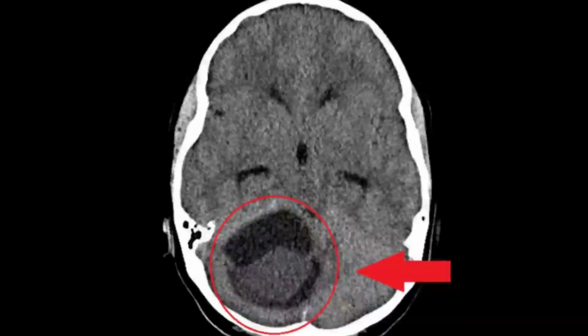Well, as you know, diffuse astrocytoma is graded as grade 2 by the WHO classification. In this case, this is not grade 2 or diffuse astrocytoma. This is actually a cerebellar pilocytic astrocytoma of grade 1.